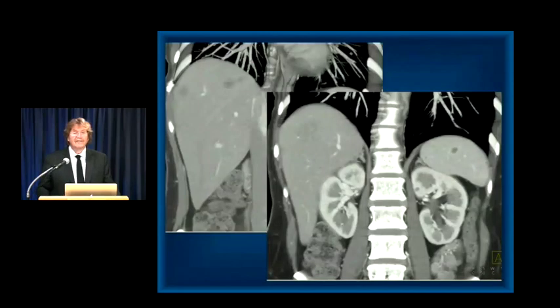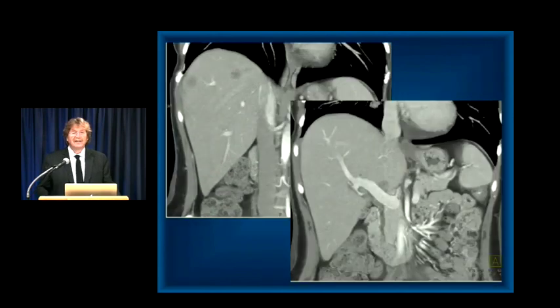And I look more carefully, there are multiple liver lesions present. I look carefully at the kidneys. There are no renal lesions present, and that is infection. And again, what type of infection? Immunosuppressed patients, you've got to be thinking fungal. Candidiasis is the one you think about. High percent of the time, liver and splenic involvement, or liver, kidney, and spleen. So again, something very important to think about.